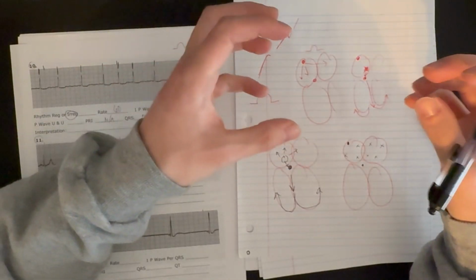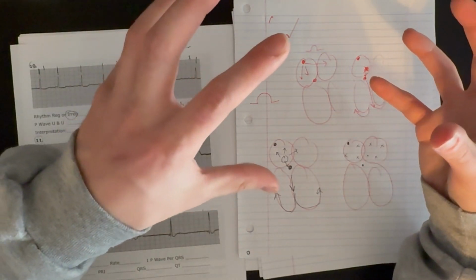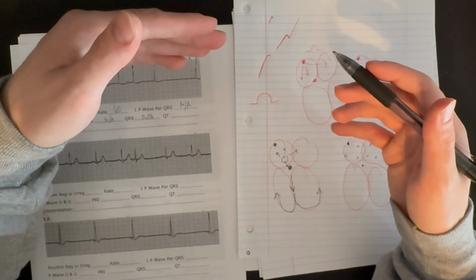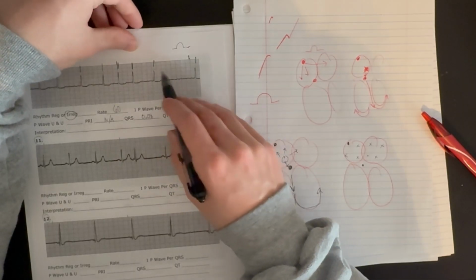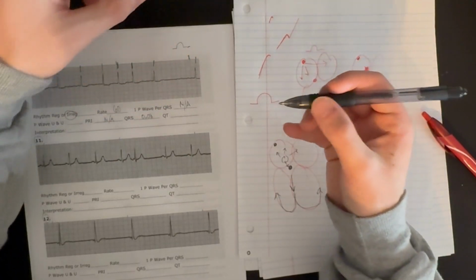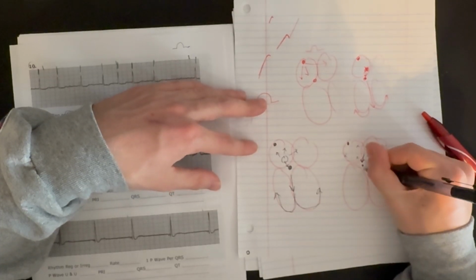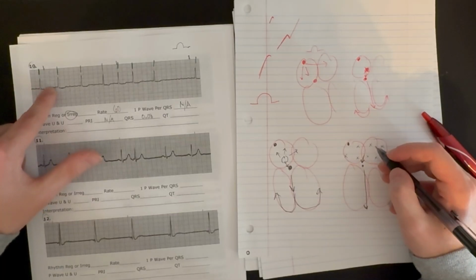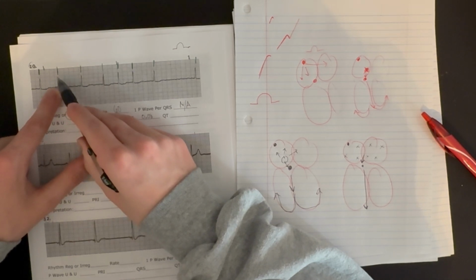There are so many impulses coming from all over the atria that are not able to create a complete, strong depolarization. And so what does that cause? That causes an irregular timing between our QRS complexes, between when a signal was actually created in the atria that can get to the AV node and then down to the ventricles, right? So chaotic activity, and then an impulse gets down through to the AV node and through that to the ventricles.